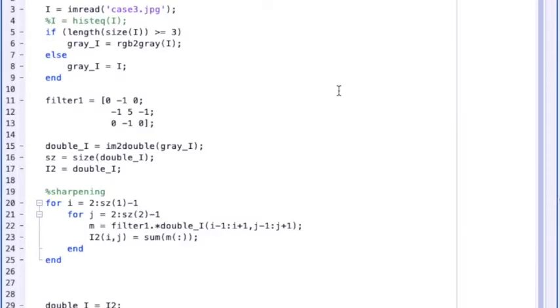Hi guys, I'm going to show you how the CSS detector works. First of all, our project is used to locate possible fracture points of an X-ray photo. This detector is based on the CSS corner detector.